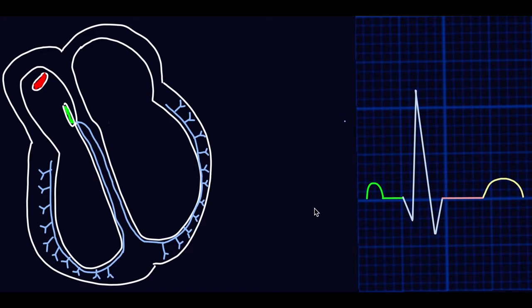The ECG. On the right, we have a normal ECG. In the second lead, the ECG gives us information about the voltage and the duration of the electrical signal of the heart. On the x-axis, the ECG will record time.